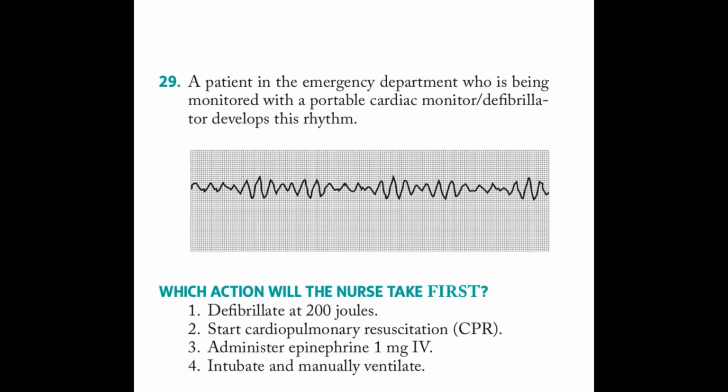A patient in the emergency department who is being monitored with the portable cardiac monitor, a defibrillator, develops this rhythm. So, which action will the nurse take first?